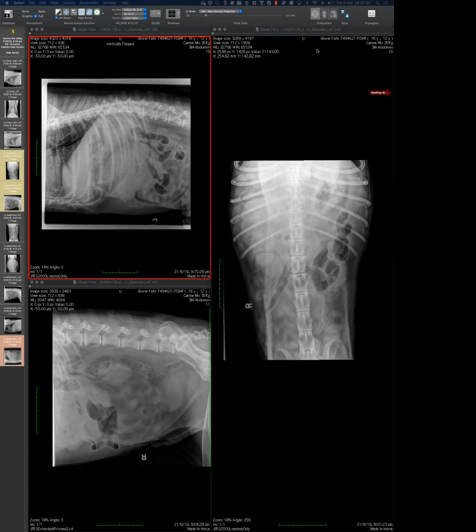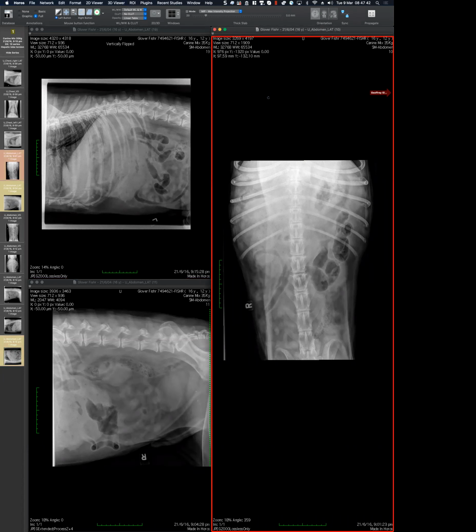Do you have that toolbar on your computer? It'll say view options at the top of the screen. Yeah, I've got that. If you click on that, there's a tab that says annotate, and it brings up the toolbar. So once you have this toolbar, then you click on annotate. Right. I've got standard side by side. I don't think I'm looking at the same thing. Don't worry, I'll play around with it during the week.